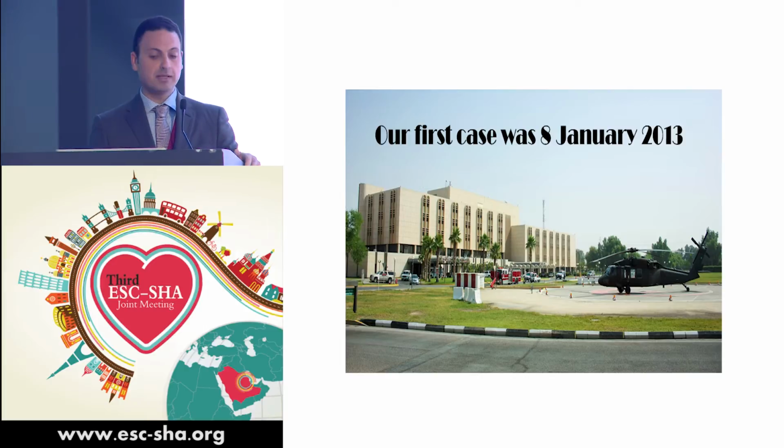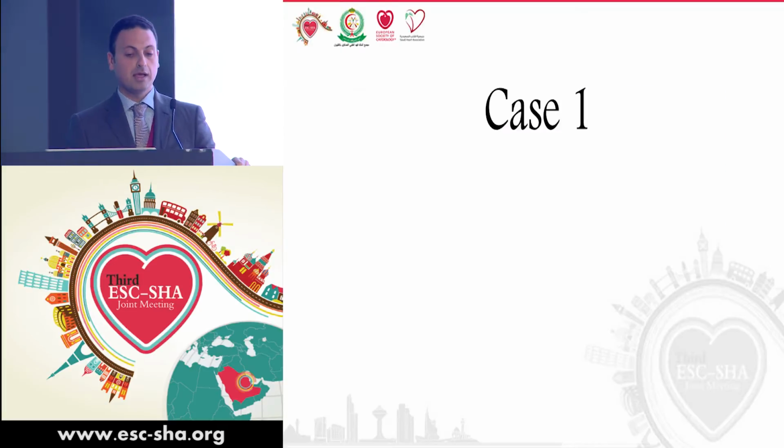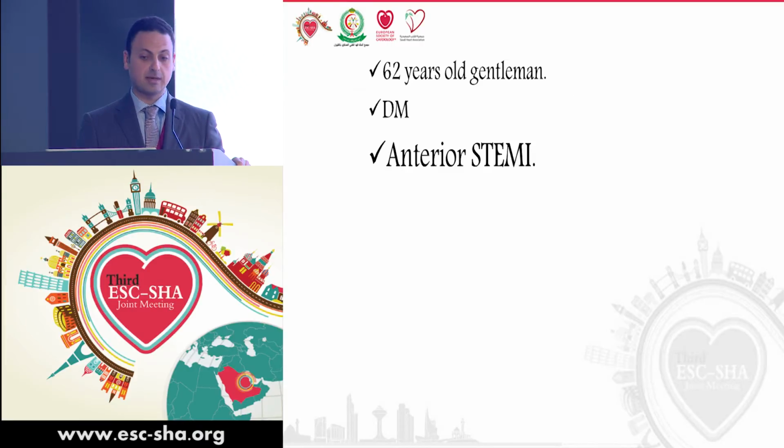In our hospital, the military hospital Dahran, we have been using OCT since 2013, and since that time we fell in love with OCT and we use it in most of our complex cases. My first case is a 62-year-old gentleman. He is diabetic. He developed anterior STEMI.